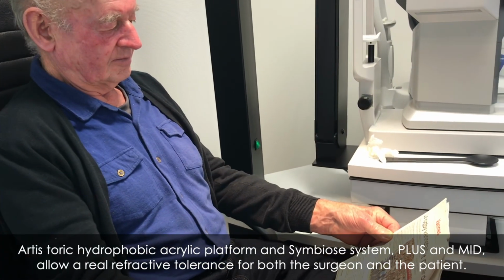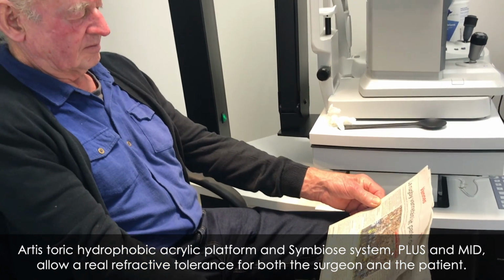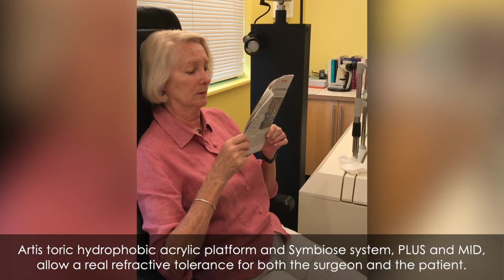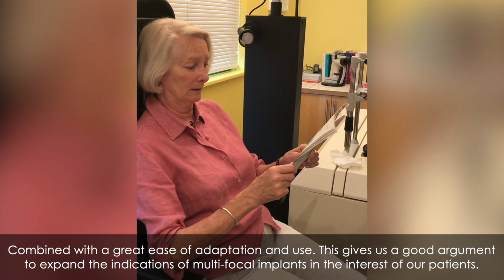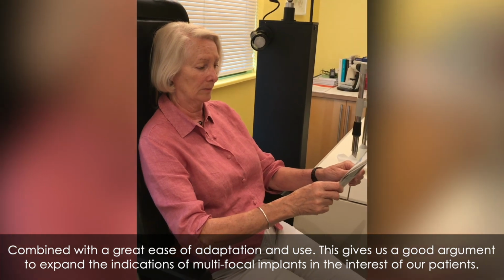The Artis toric hydrophobic acrylic platform and Symbiose system, PLUS and MID, allow a real refractive tolerance for both the surgeon and the patient, combined with a great ease of adaptation and use. This gives us a good argument to expand the indications of multifocal implants in the interest of our patients.